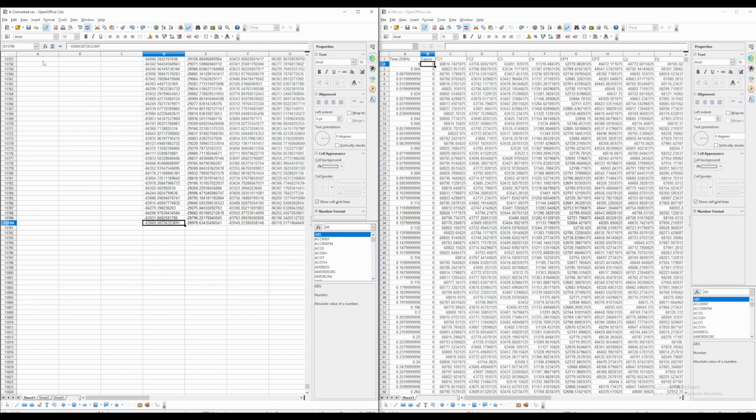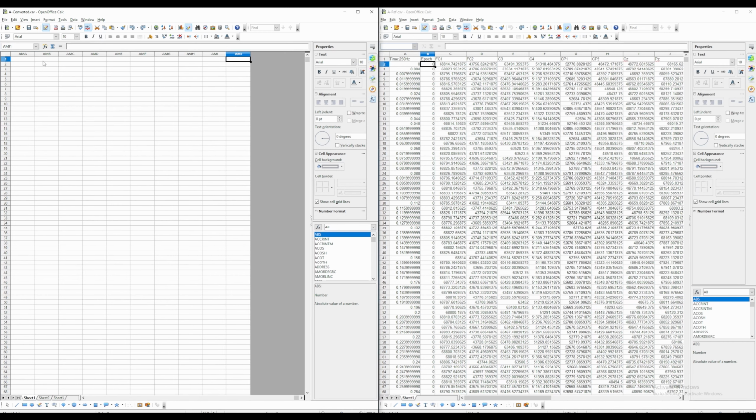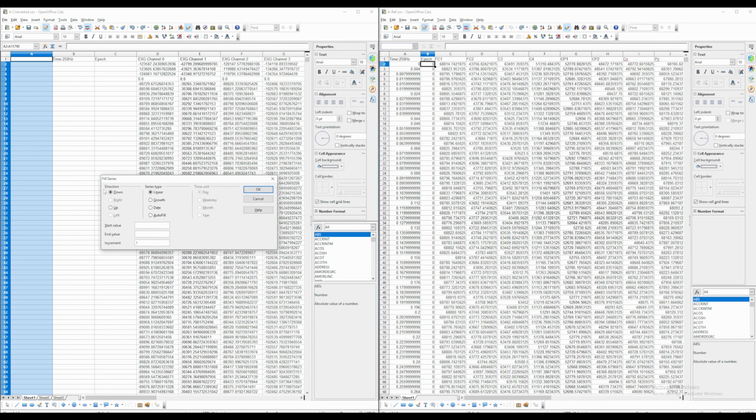Here I release Control and I go left, 1, 2. And now again, I hold Control and Shift, because Shift selects up and down. But if I hold Control, it will jump all the way up. Now let's do that again. Control Shift up. All right, now we have this column selected. Can deselect the first one. So hold Control and click and go to Edit, Fill, Series.